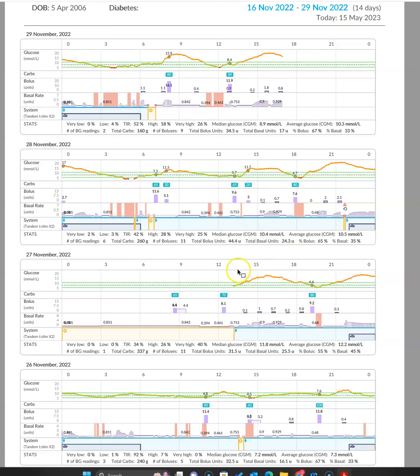So from these top two, we can see here that the insulin is delivered for a late lunch, and it looks like it's being delivered before, yet the insulin is inadequate and the system's had to kick in with extra insulin and auto correction to bring them back down.